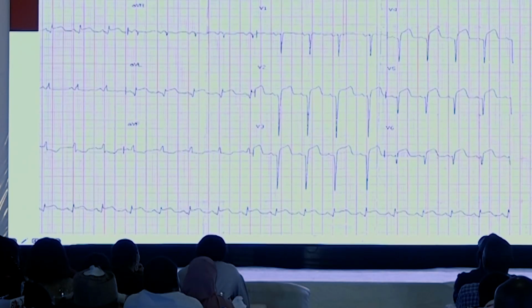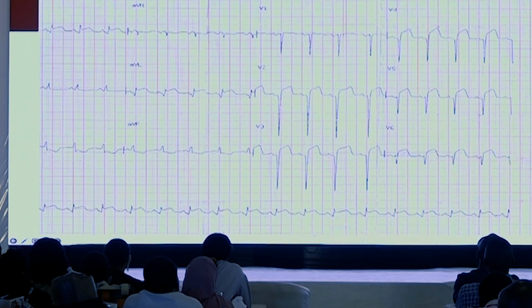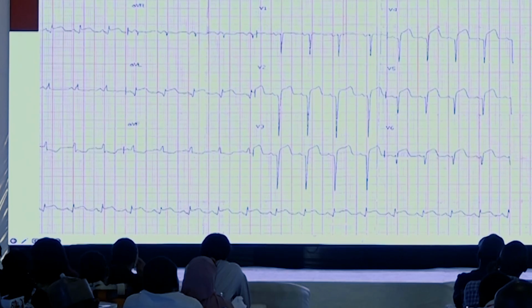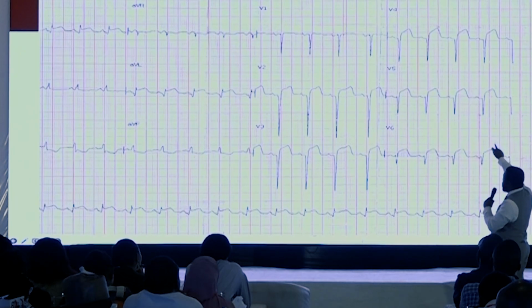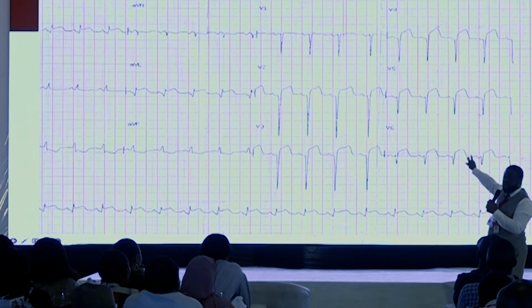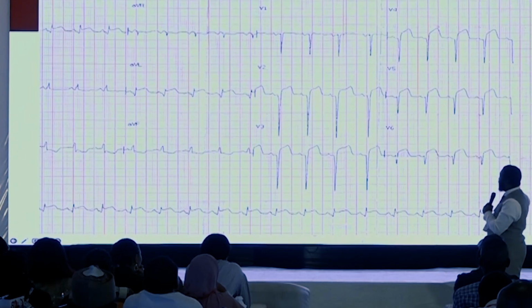Some people are not even talking on your own seat by yourself. Talk now. It helps you. So if you missed it, you will now say it. Nobody will know. V1, V2, V3, V4, V5. You can see there's a small notch, so it's not yet a Q wave. So it's no longer the first negative deflection. So 1 to 4. And there's ST elevation.